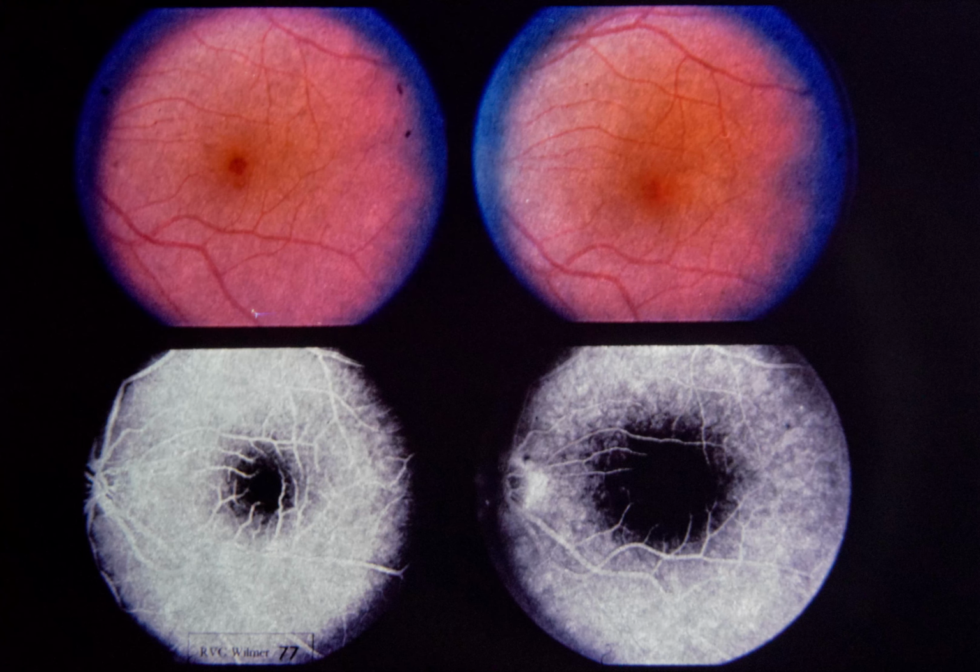Slide 77. Idiopathic macular hemorrhage. This 36-year-old white female was in good ocular and systemic health when she noted loss of vision in the left eye on awakening. A complete medical and hematologic evaluation was entirely unremarkable. Right eye vision was 20/20 and left eye vision was 20/40. Examination was normal except for a small round hemorrhage in the left macula, upper left.